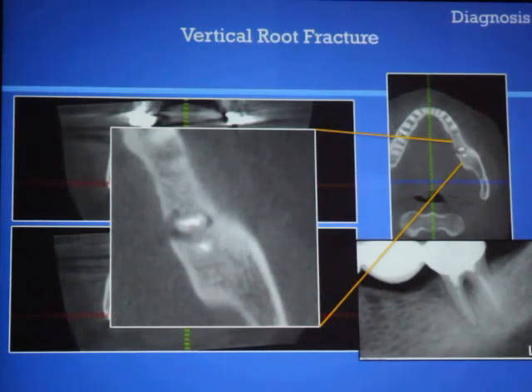Và các răng này có thể có nhiều các vị trí giò bởi vì cái tổn thương xương có thể nằm cả mặt trong mà cũng có thể nằm cả mặt ngoài của xương. And a furcation radiolucency, because as the bone loss that starts against the root moves on the lateral aspect, it shows up on the radiograph in the furcation area or on the side of the root.